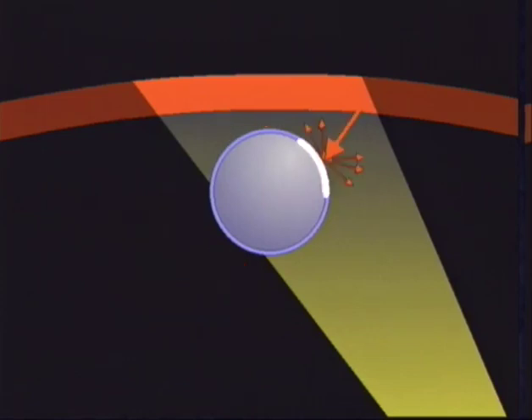If the object has a lower index of refraction than its environment, reflection will occur on the same side as the incident light, and an illuminated crescent will be seen there. If the object's content is of a higher index of refraction, the object may act as a light guide, and the light is guided to the side opposite the incident beam. Due to internal reflection, the illuminated crescent is seen on the opposite side of the incident light.